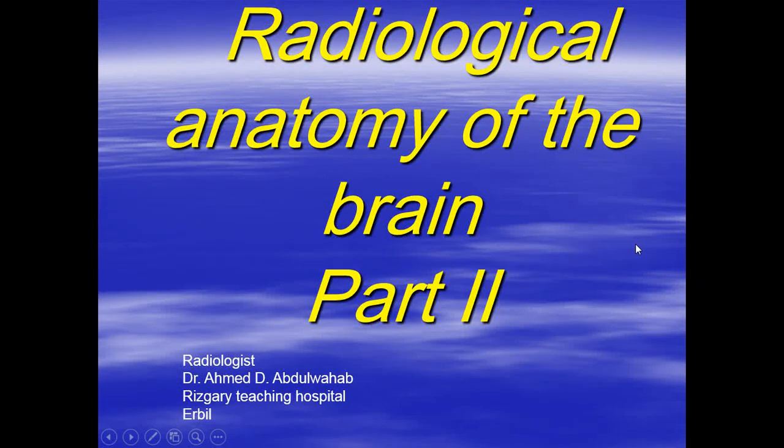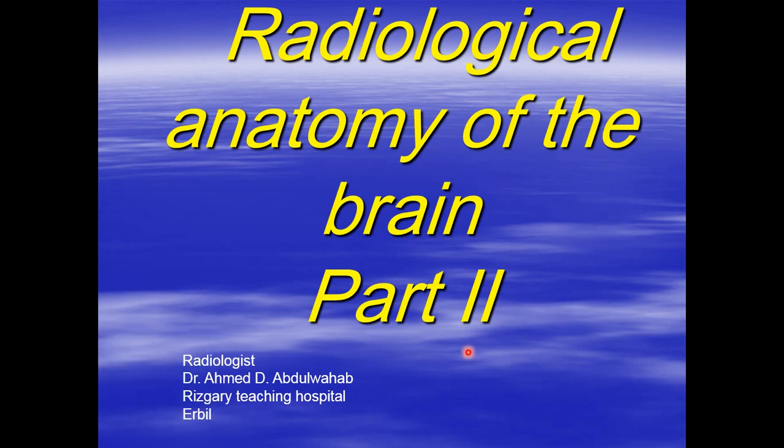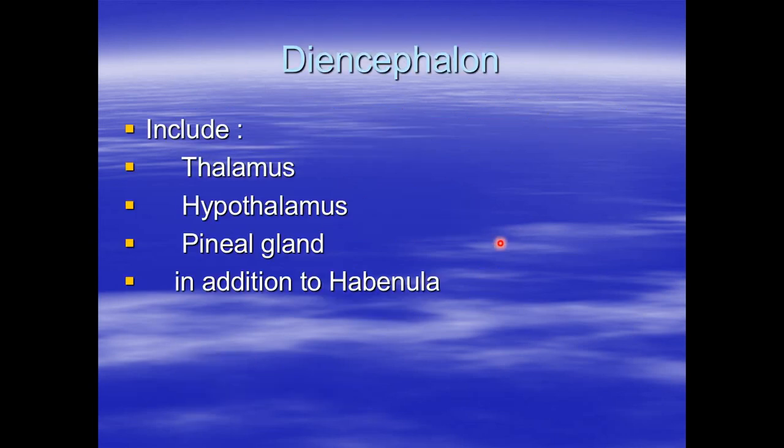Everyone, today we will continue with our presentation on the radiological anatomy of the brain. This will be the second part, and we will continue later with the third part. So last time we were at the Diencephalon.